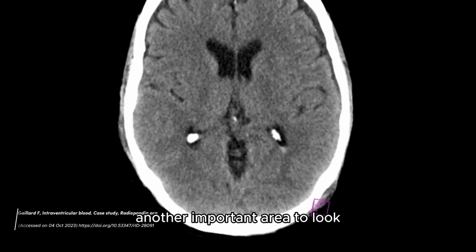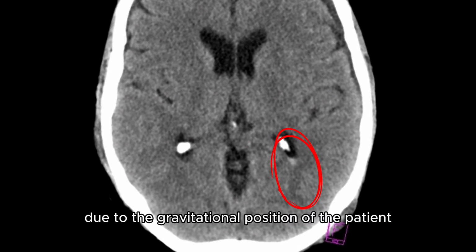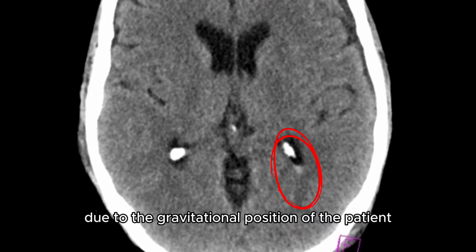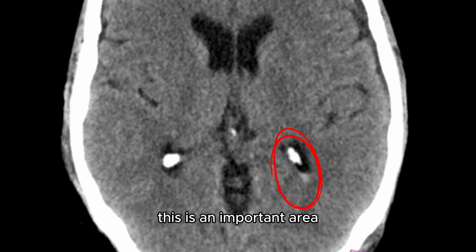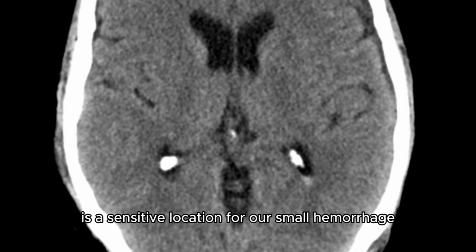Another important area to look is the occipital horn of the lateral ventricles. Due to the gravitational position of the patient laying down, this is an important area to keep within your search pattern, as this place is a sensitive location for a small hemorrhage.